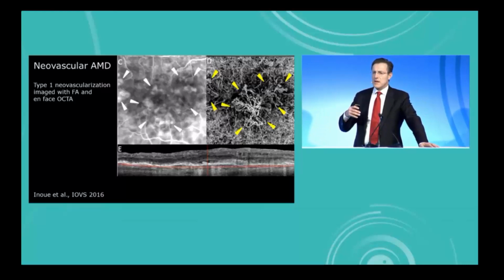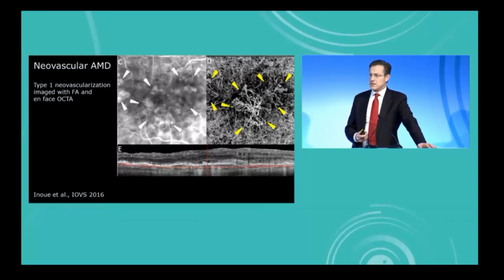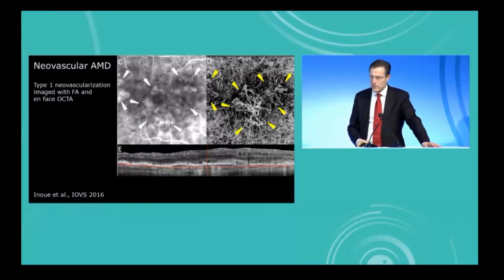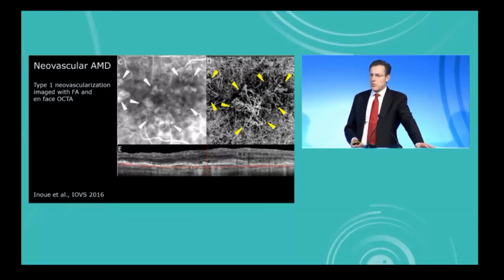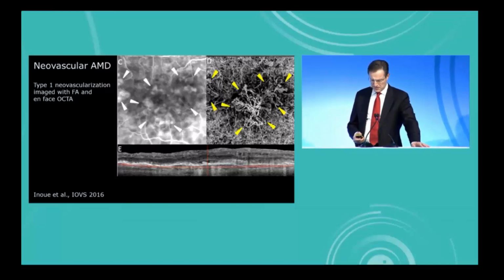You can build instruments that automatically do segmentation of the retina and the choroid and present you with a qualified guess about where you have the inner capillaries of the retina, the outer capillaries of the retina, the neovascularization, if there is a choroidal neovascularization, the choriocapillaris and the deeper layers of the choroid. And then when the anatomy begins to become abnormal, it gets more and more challenging for the algorithms to follow the perturbed lines of the retina, especially the outer retina.